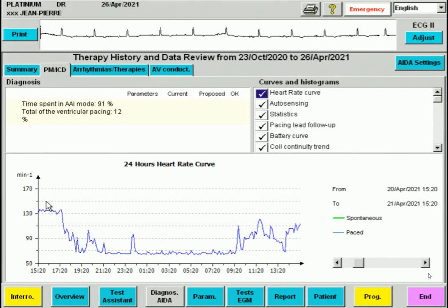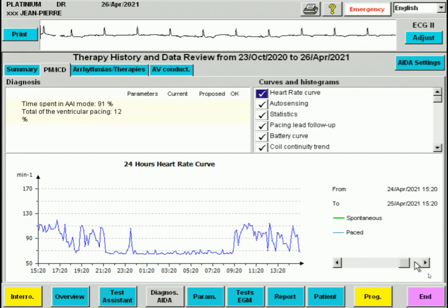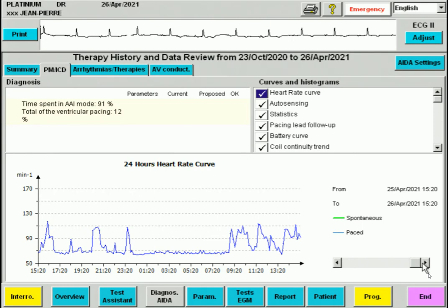We observe that the patient has had an episode of maximal tracking, which corresponded to a cycling exercise. We note that perhaps the rate modulation has been a bit too aggressive. We don't see this plateau during the other days of the week. We also do not observe other peaks which may indicate the occurrence of a tachycardia.